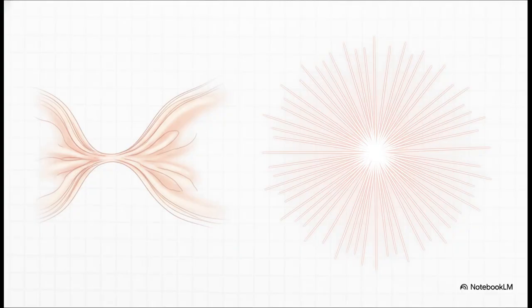So, what does this footprint actually look like on a mammogram? Well, radiologists are on the lookout for a few key things. They might see tissue that looks like it's being tugged inward. That's called focal retraction. But the classic sign, the real giveaway for AD, is seeing these thin, straight lines all radiating out from one central point, kind of like spokes on a bicycle wheel.